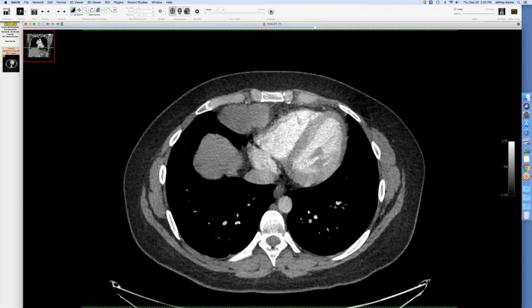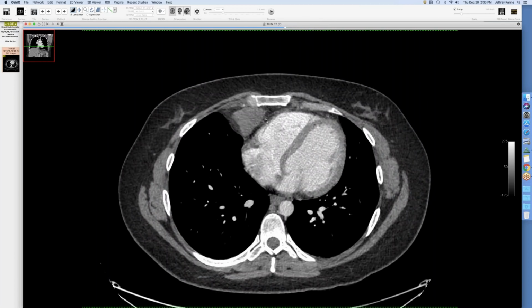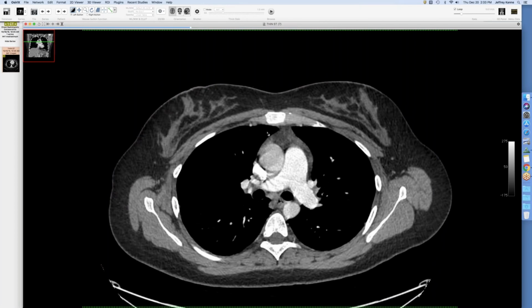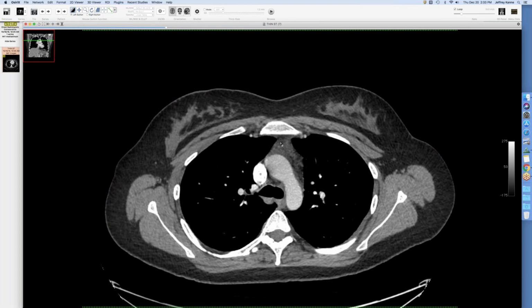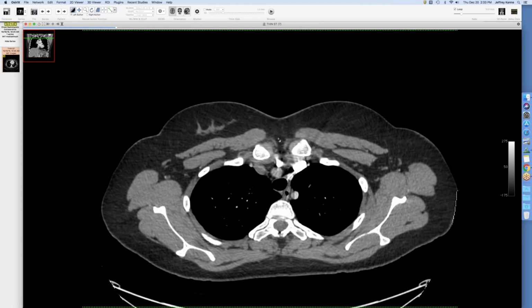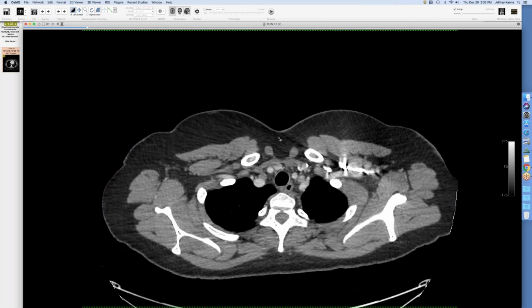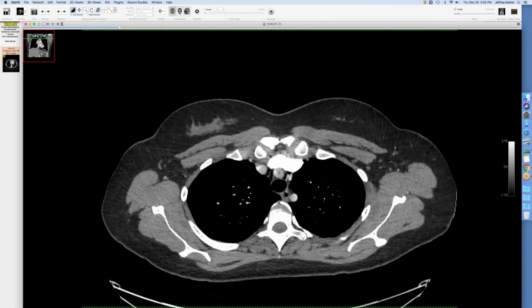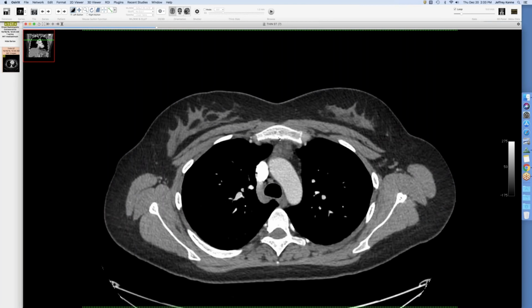Uh-huh. Yeah, I mean, I would have had to bet on thymoma, even though she's 30-something, because it just doesn't look like lymphoma. It's not thymic tissue. Here's our normal thymus here, and it's not a germ cell tumor. It just didn't have the right look. And in females, they're usually teratoma, so we expect to see some fat or something. And sort of an incidental finding. So they took it out, and she's doing okay.